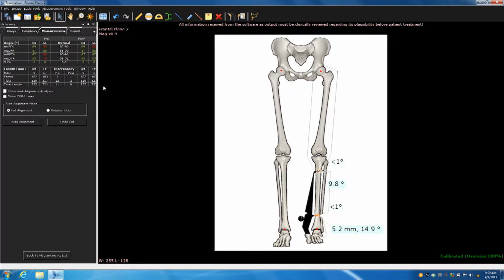Yes, I think that's, so if you look at the little highlighted numbers, it'll tell you that you've corrected your proximal osteotomy 9.8 degrees. Your distal osteotomy not only corrected 14.9, but you translated 5 millimeters of length with the pure opening wedge. Or I should say it distracted 5.2 millimeters. So you know how much length that you gained on the opening side.